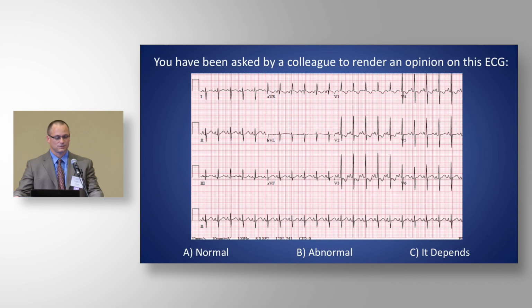So I'm going to ask you a question. Hopefully you can see these ECGs. Some of them have been washed out. So here you go. You've been asked by a colleague to render an opinion on this ECG. And there's simple categories: normal, abnormal, and it depends.